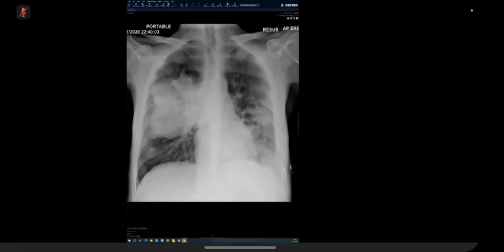So you have multiple lesions in both lungs. I need a differential and I need next steps. This may be multifocal pneumonia, may be metastatic in nature, but I need to review the history of the patient and approach the patient for further CT for evaluation.